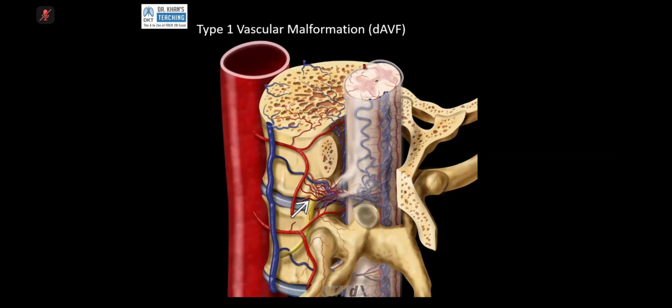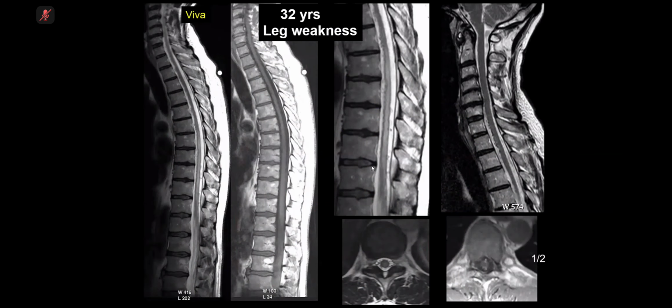And now, let me show you another case, which is this one. You have to develop your eyes on the surface of the cord, just like candidate 1 did very well. She picked it up, but that case was easier, and this is slightly more difficult because it is not as emphatic as the one which I showed you today. You can see this, we call it serrated outline of the cord.